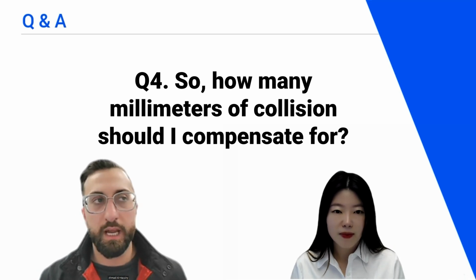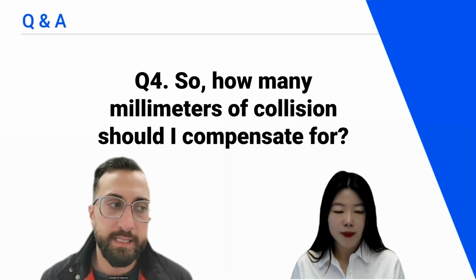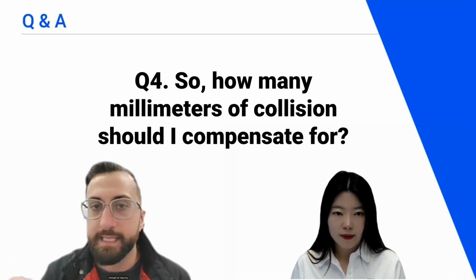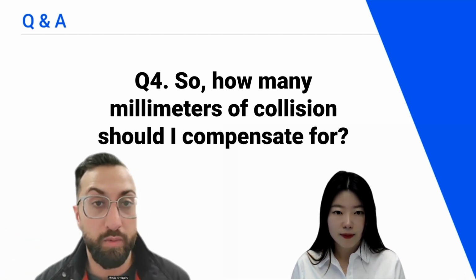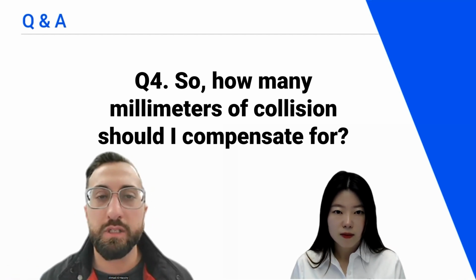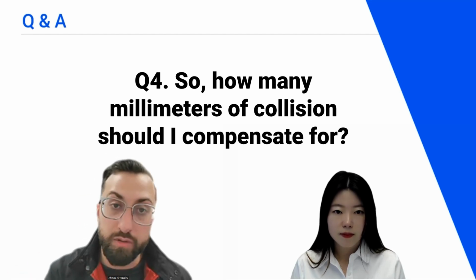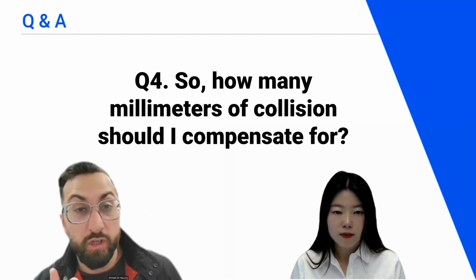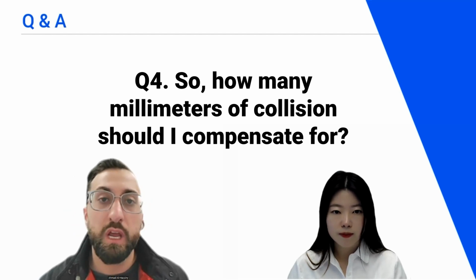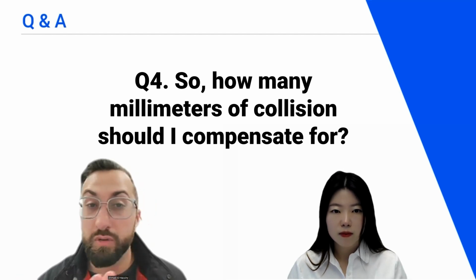Yeah, and it's like what I was mentioning, intersections are probably the most common error that happens with bite scans. And as I was mentioning, look, if it's a few little spots throughout the bite scan, I'm typically okay with this. But if it's a significant intersection, and you will see it, it's not about millimeters, but you will see it. If you just turn the bite scan around so you can see through the underside of the scan, as I was showing you guys, and you see a lot of intersection, that is when red flags arise. And typically what I would do is rescan.